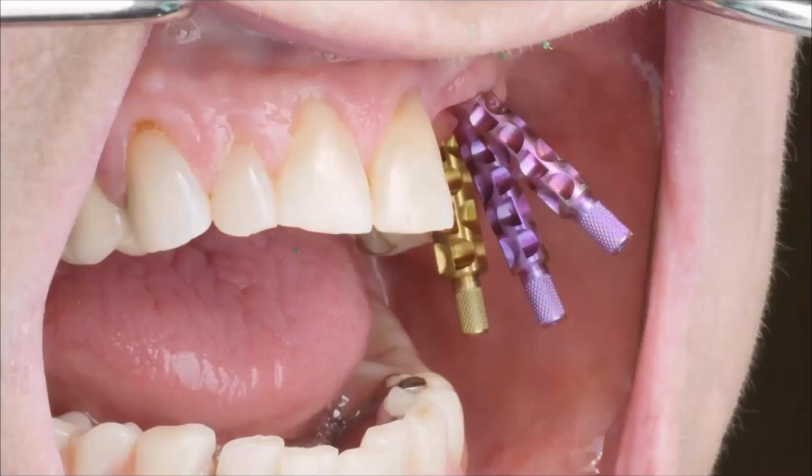This is a case that was restored at MUSC with really severely poorly placed implants, right? So here are the impression copings. You don't have to have a lot of dental or implant experience to understand that especially the most anterior implant is severely malpositioned, and it's questionable whether or not it's even restorable.